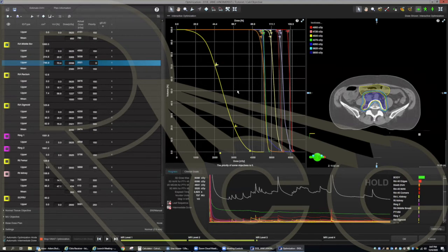Otherwise, what you'll see is, if you turn on all of your locked structures, so right now I've locked all of these. This one's overlapping, I won't show. You'll see that after all of them my shoulder just won't move up. I can't get this thing to move up. I see that all of mine are still below the locked structures, except, let's pretend this one came up here.